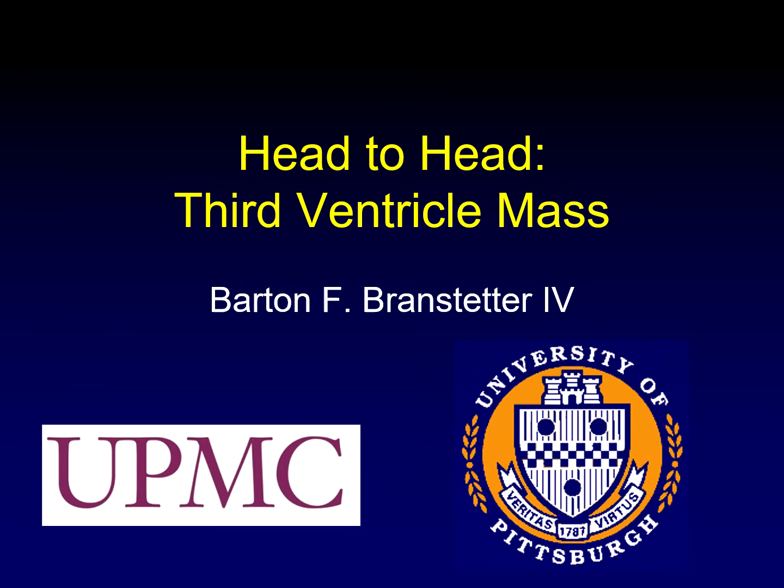In the head-to-head series, I show you two different patients with two different diseases, but similar radiologic appearances, and you see if you can make the correct diagnoses. Today's topic, an anterior third ventricle mass.